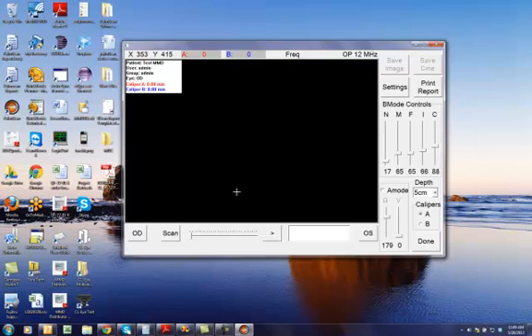Okay, so now that the probe has been plugged in, let me go through some of the features on the system. These are the B mode controls, which are the gains for the near, mid, far. I is for intensity and C is for contrast. You can also change the depth of the image that you're scanning from between 3 to 10 centimeters. Every time you change the depth, the frequency of the probe gets updated up here.